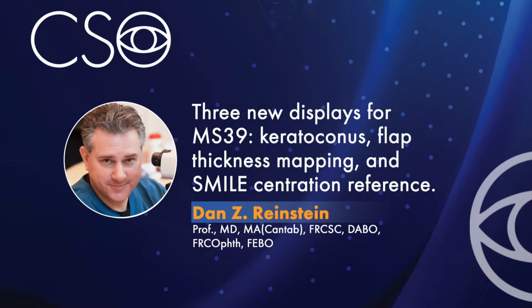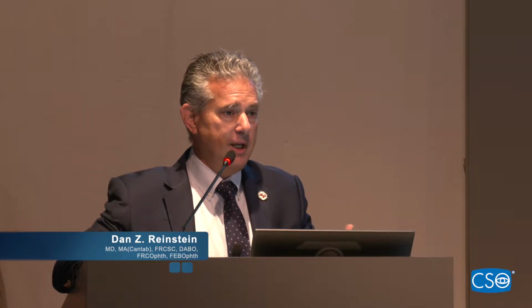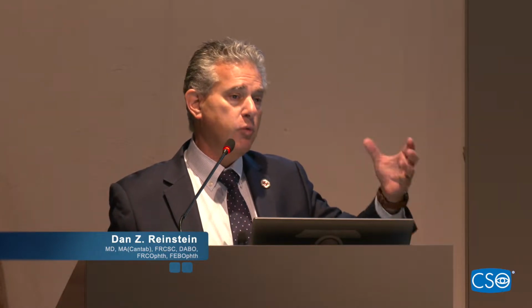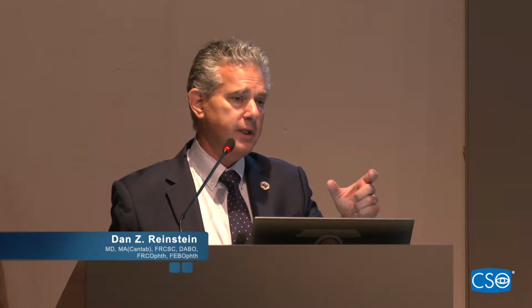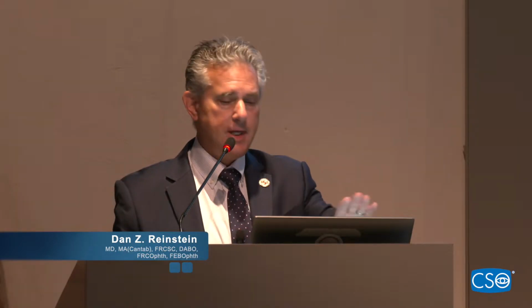Like I said, what I'm going to do is use the software in front of you the way I set it up and the way I use it. The settings we have here are settings that we chose as a preference in our clinic. We have suggested to Francesco that it may be possible, if you want, to ask for these settings in your clinic. Currently, when you receive an MS39, it doesn't have these settings.